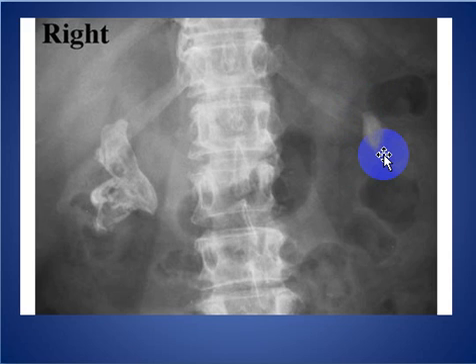and about 75% of cases of staghorn calculi are due to struvite stones, composed of struvite carbonate apatite matrix, and these typically develop from urease-producing bacteria called Ureaplasma urealyticum and Proteus species. These stones don't pass spontaneously because they are large and they grow, and should be removed surgically. Also, we see here degenerative disc disease changes involving the lumbar spine. So this is a classic staghorn calculi involving both kidneys, larger on the right side.